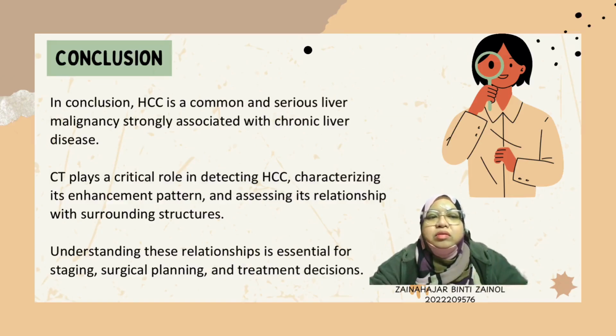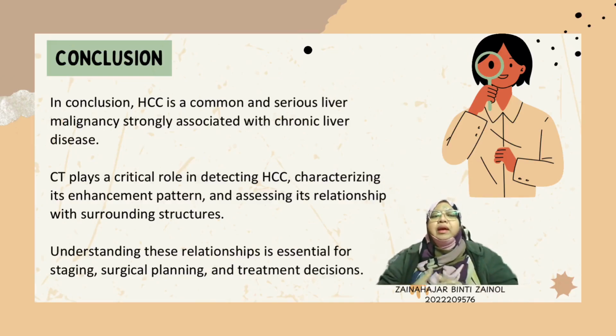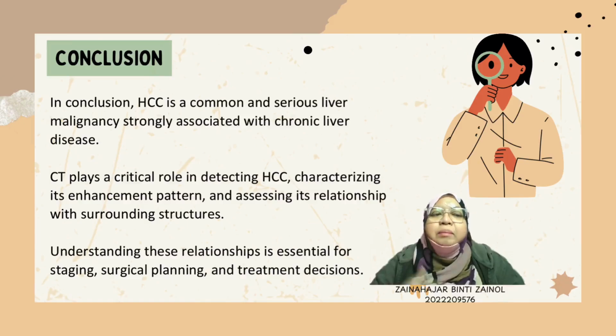CT also allows us to assess how much the liver parenchyma is involved and provides essential information for accurate staging and treatment planning. By understanding these CT features, we can achieve early diagnosis, guide appropriate management, and ultimately improve outcomes for patients with HCC.